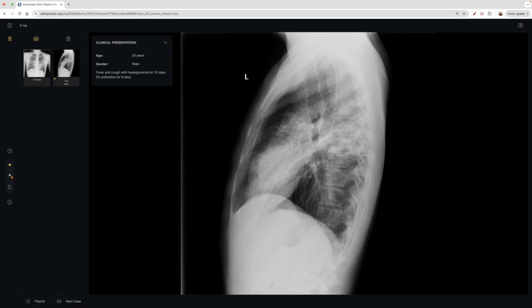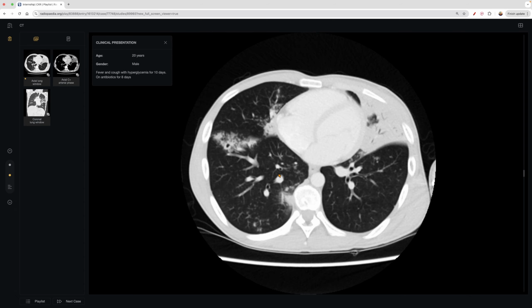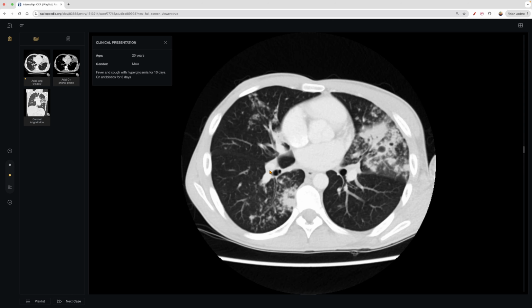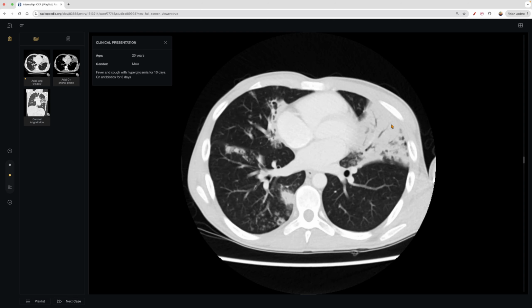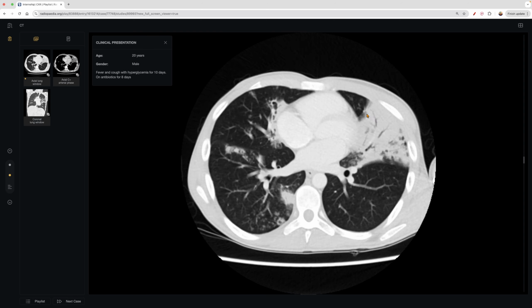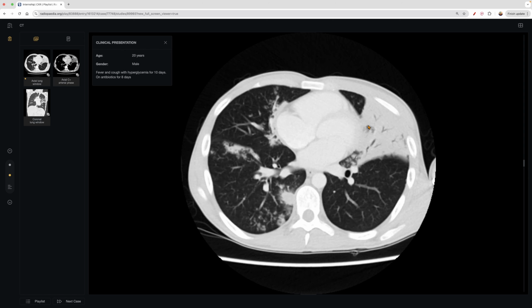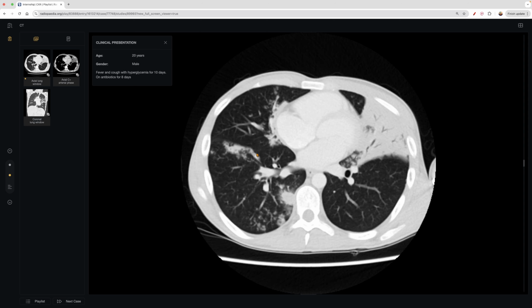And then we get a CT scan, and we see that this patient, on the right side, let's scroll up here. So we're scrolling superiorly. Let's look at the left side here. The air bronchogram, this was a consolidation, right? And it's of the upper lobe, and that's why we lost a little bit of that cardiac border. And even here, you can kind of see it. It's a little difficult to appreciate that border. You can see it here, but you can determine why on a chest radiograph it would be a silhouette sign.